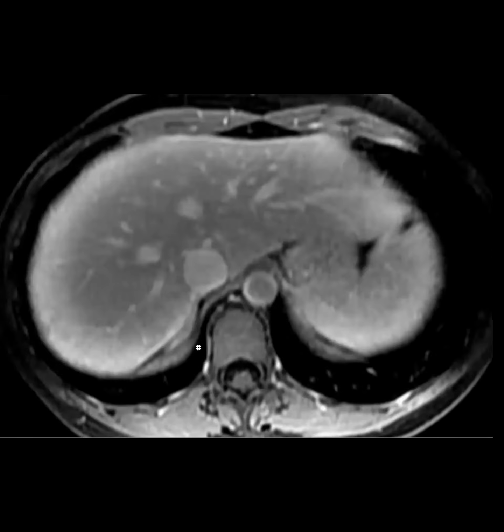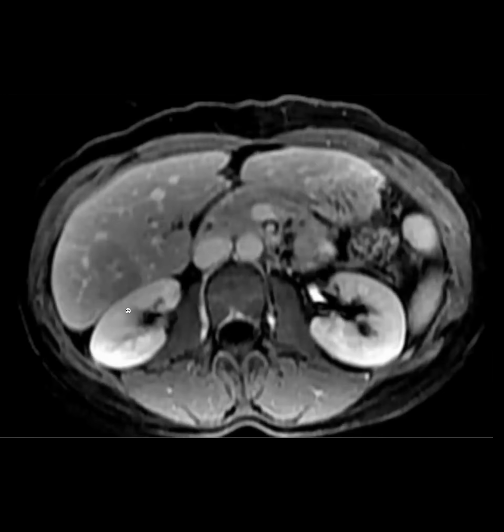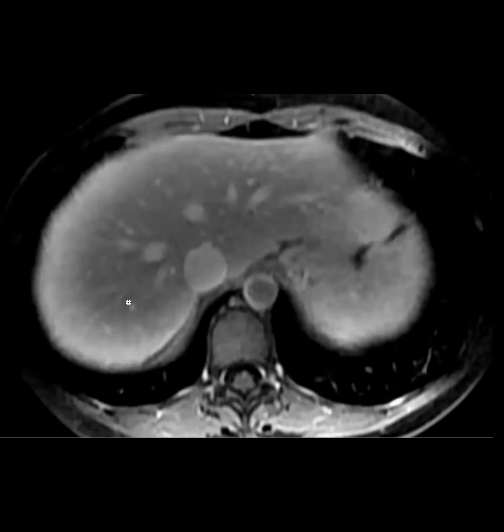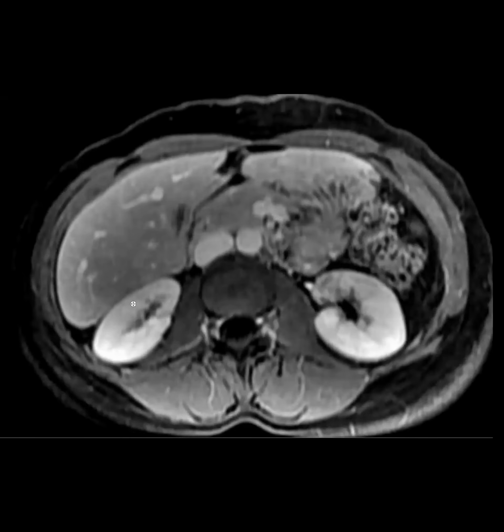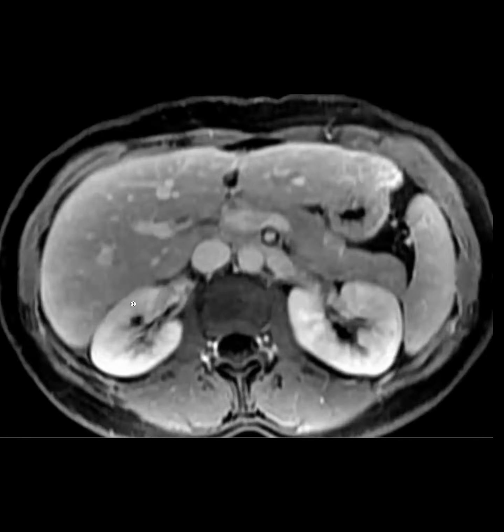I feel like one of the lesions has a scar too on post-contrast. Yeah, like this one here, right? Yeah, sort of a scar in the lesion. I would have to very respectfully state that I would be very, very cautious with thinking about FNH whenever you have any washout.